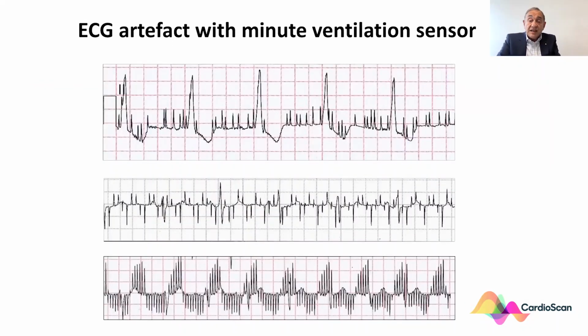Here are just 3 illustrations of different ECG patterns seen, and they are not consistent. Again, sometimes the filters of the ECG machine wipe them out and you get them appearing and then disappearing, appearing and disappearing. And they give quite characteristic but different pictures.